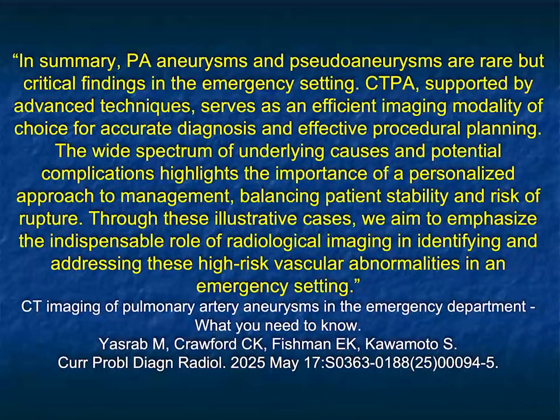I've shown you a little bit of the amazing spectrum of pulmonary artery aneurysms and pseudoaneurysms. They're rare, but they're important to diagnose because of high morbidity and mortality. Earlier diagnosis allows for quicker treatment, often with embolization, and the patients will do well.